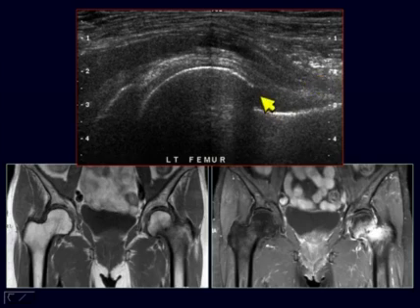For confirmation in an individual who already had an initially occult radiograph, you might need an MR. Suffice to say, though, that we already appreciated it and saw it on ultrasound. So here on a coronal proton density, or T1 image, you see a signal void, a linear signal abnormality across the subcapital region on the left hip, very different from the contralateral right hip.